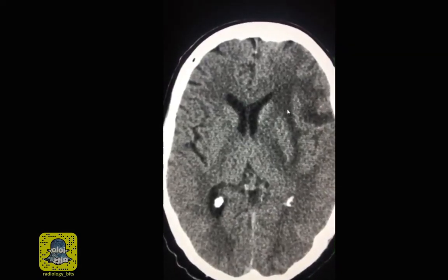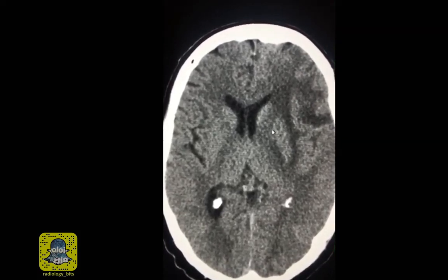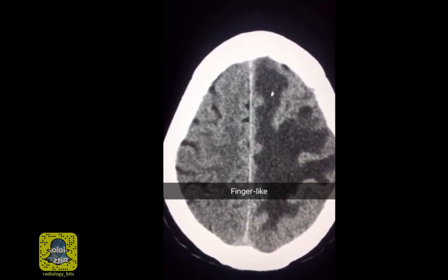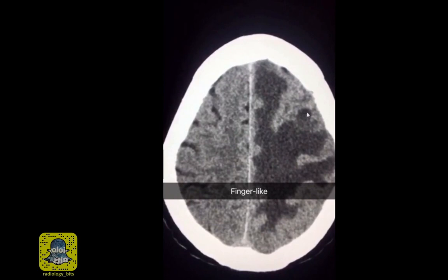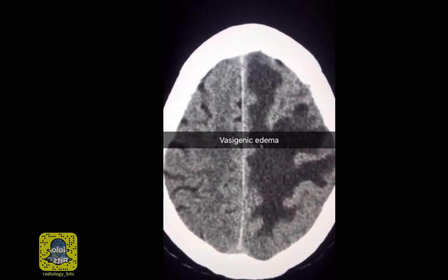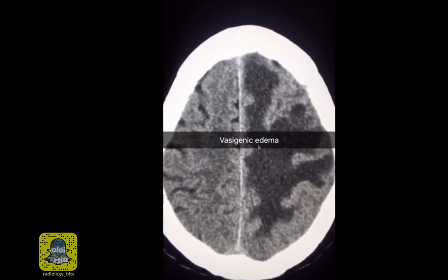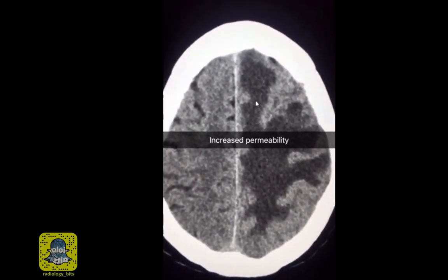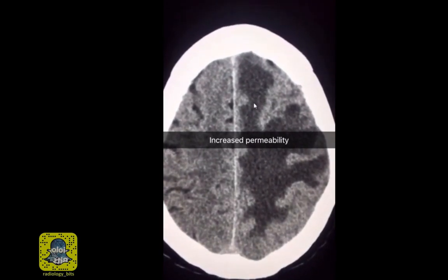Along the same lines, although the edema extends all the way to the deeper white matter areas, the gray matter is preserved. Since the edema involves the white matter and the gray matter is preserved, the appearance is similar to finger-like projections in between gyri. Although this is brain edema, this is a different type of brain edema, a type that we call vasogenic edema. To simplify understanding this type of edema, it's really related to permeability of the vessels.